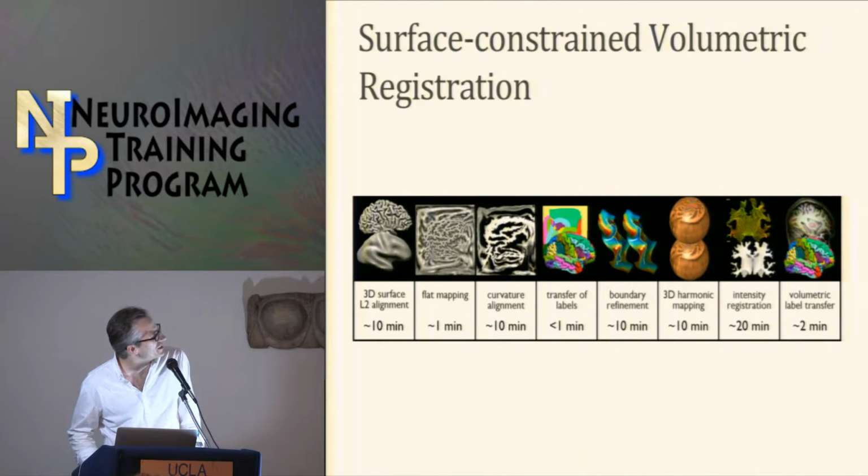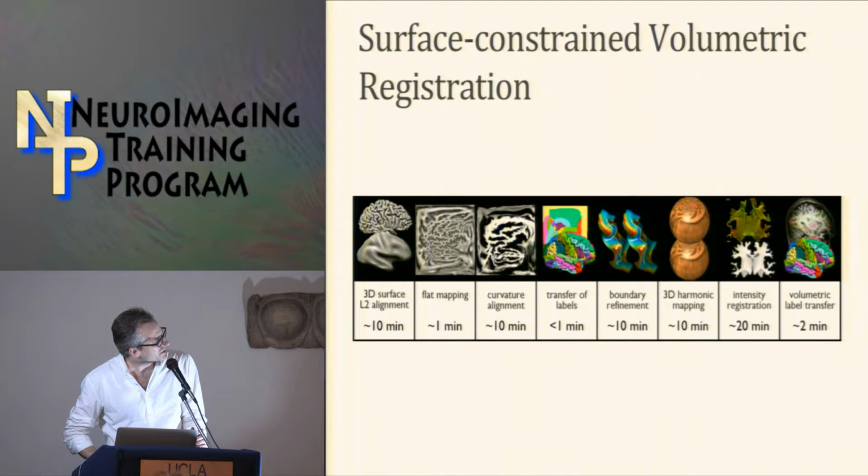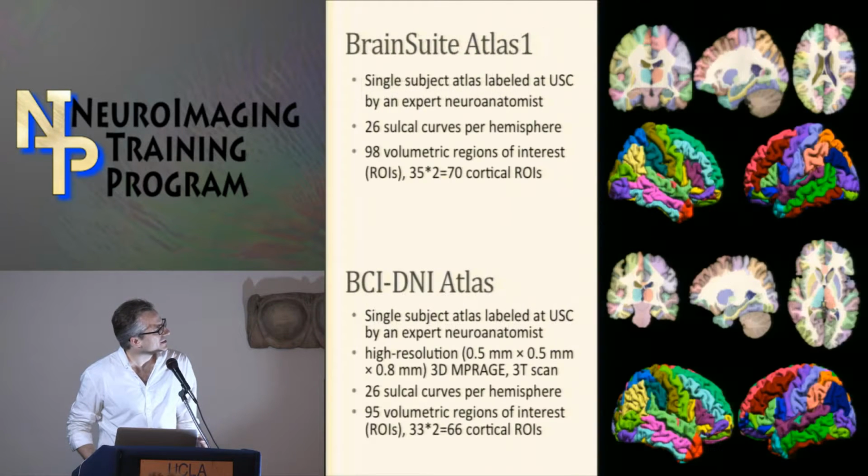But moving back to the more serious components. Once we've generated the left and right hemispheres, we can use these to perform the surface and volume registration process that I mentioned. This is the series of steps. This is a method that was developed by Anand Joshi, and he's continued to refine it over the past several years to make it more reliable and to work with an atlas that was labeled by Hannah Damasio at USC. The process relies heavily on having a good, accurate atlas.